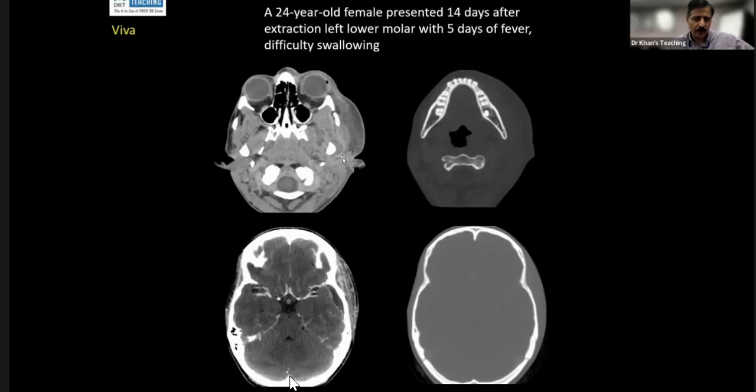The epicenter is along this is the mandibular condyle, etc. Part of it is abscess, part of it is phlegmon. And then it goes all the way up here. You remember masticator space goes all the way to the base of skull to the temporalis muscle here. And from there, the infection has gone in. So there is a subdural empyema here.